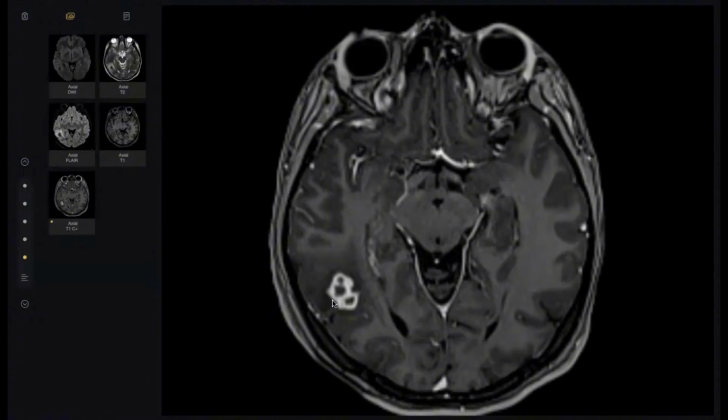So this location, what's its significance? Metastases are more common here. And what else? No, this is not the watershed. This is the site of blood-borne pathology, the gray-white matter junction. Try to integrate the whole finding of abdomen, chest, and the brain.